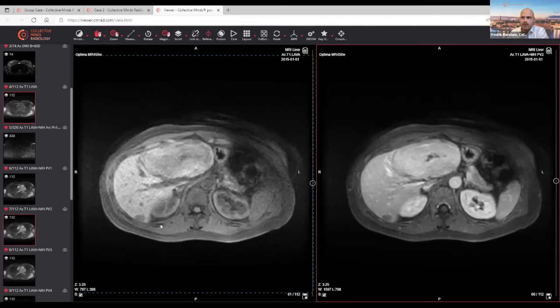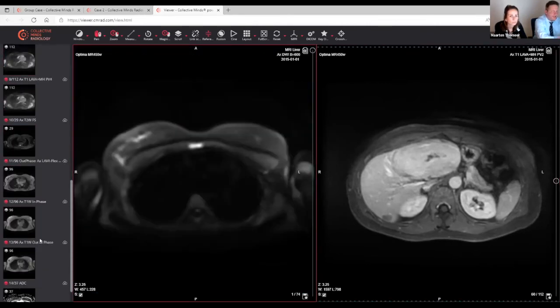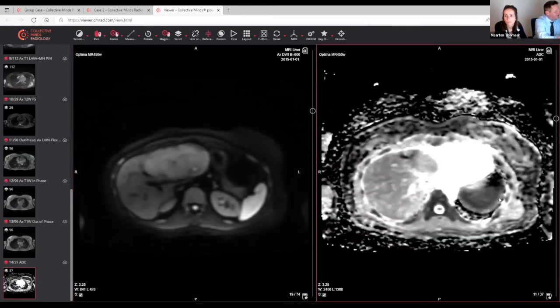We had one final question: can diffusion weighted imaging distinguish between steatotic HCC and adenoma? Well, I think the diffusion characteristics of an HCC are quite typical. They show diffusion restriction. I didn't show it here, but if there's real restriction, like maybe in this case there is. Let me show the diffusion. It was a beta-catenin adenoma, and we published this case also. Inside there was a nodule in nodule, and there was a lot of restriction in the lesion.